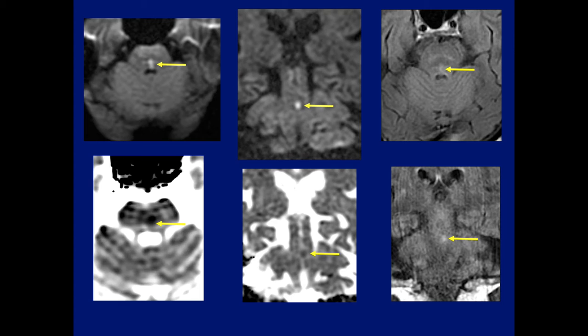But I'm not just going to show a stroke. What structure is involved? A very important structure. Correct. Asif mentions the medial longitudinal fasciculus. And that's what it was. The patient had symptoms for 2 days prior to the study.